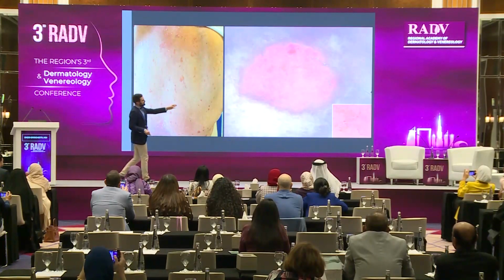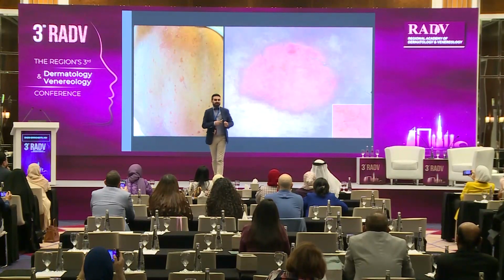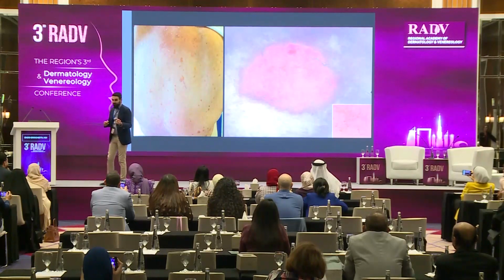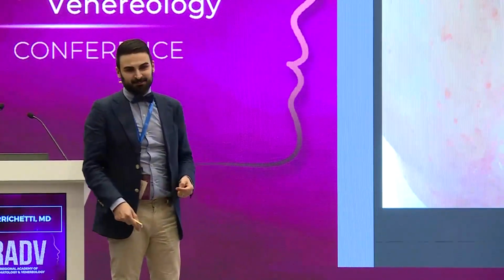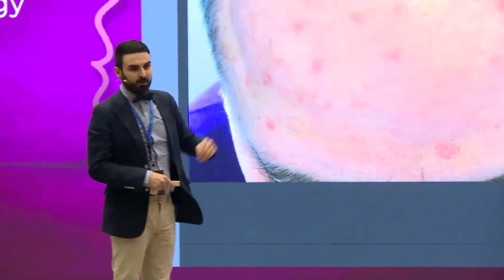It's orange with just a few dotted vessels. We have to think always about a disease which is another great imitator. Syphilis. Even in syphilis, we have hemosiderin deposits, so we see orange.